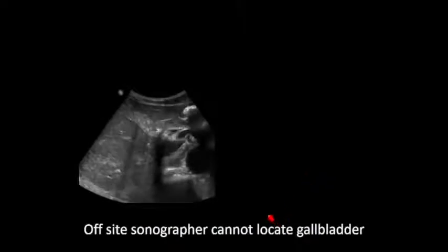This was an off-site, so our off-site sonographers in some offices do not have a radiologist on site. Others do. So if there's nobody there, they have to call before the patient leaves. And the call came in that the person there just couldn't find the gallbladder. Patient says they didn't have a cholecystectomy, and she says, I don't know, I don't see the gallbladder.